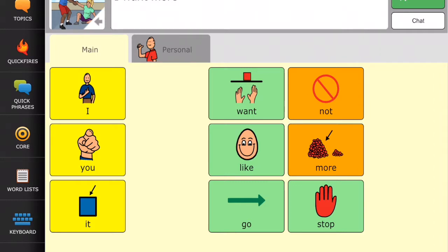For individuals who have motor issues or difficulty moving their fingers or their arms, touching that small little green button is complicated. Sometimes you'd like to touch the sentence strip, or once you finish typing your sentence, it can speak for you, or eliminating the sentence strip altogether. I haven't found a way to do that using this app, so currently this is something I did not like.